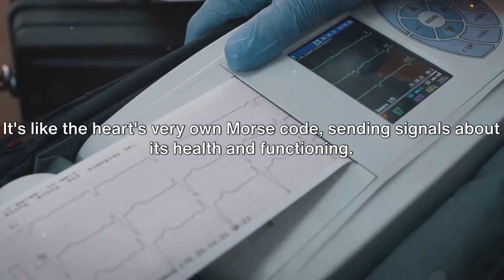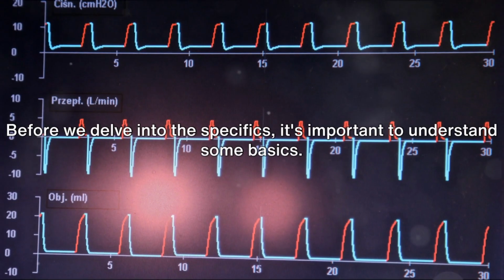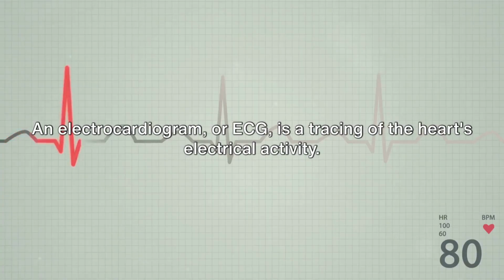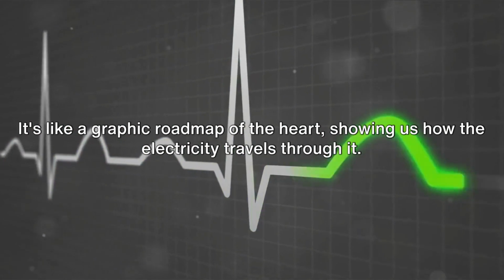It's like the heart's very own Morse code, sending signals about its health and functioning. Now, let's dive into the process of reading an ECG. Before we delve into the specifics, it's important to understand some basics. An electrocardiogram, or ECG, is a tracing of the heart's electrical activity. It's like a graphic roadmap of the heart, showing us how the electricity travels through it.